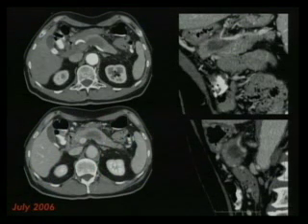This was another case. The patient came with abdominal pain, and we have this CT. We have this ill-defined low-density abnormality at the level of the pancreatic body. Remember that the splenic vasculature goes close to the pancreas.